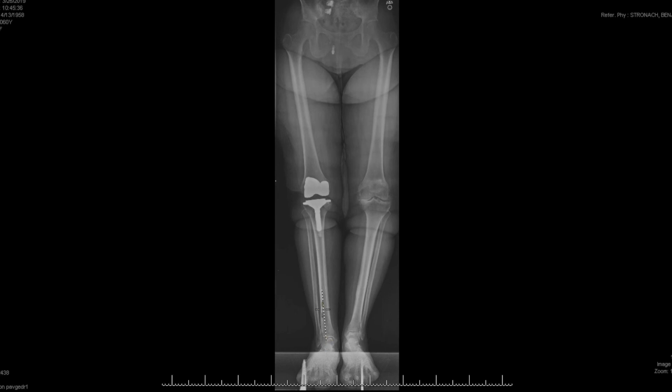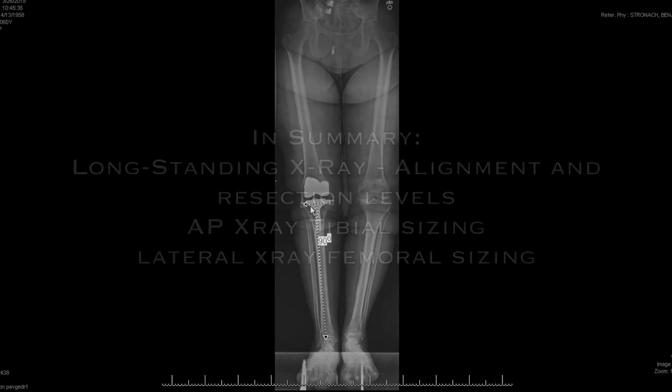A similar line can be drawn for the tibia, where a line is drawn from the center of the ankle up to the implant, and you then draw a line across the face of the implant, and we're right at 90 degrees in this case. You can also use the TraumaCad software to do this with its outcome tool, which can be quite helpful.